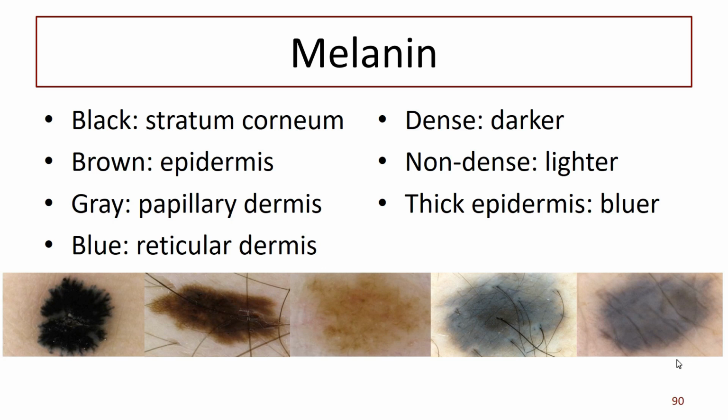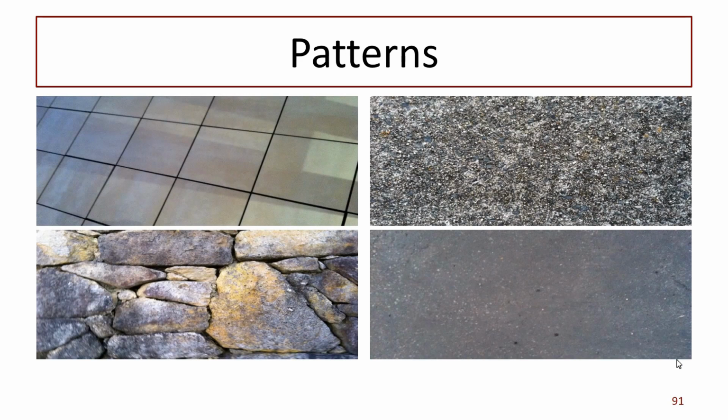So we've seen some very blue-coloured melanoma in situ. So usually if you're thinking about deep melanoma, it's going to have blue colour if it's still pigmenting. But a superficial melanoma sometimes can have blue too if it's got so much thickness to it, even within the epidermis, that can happen. It's rare.